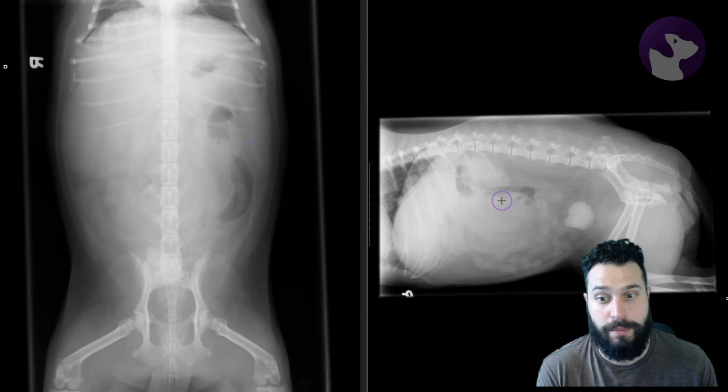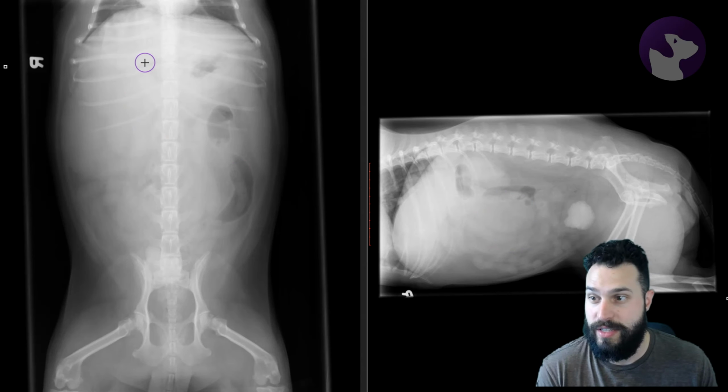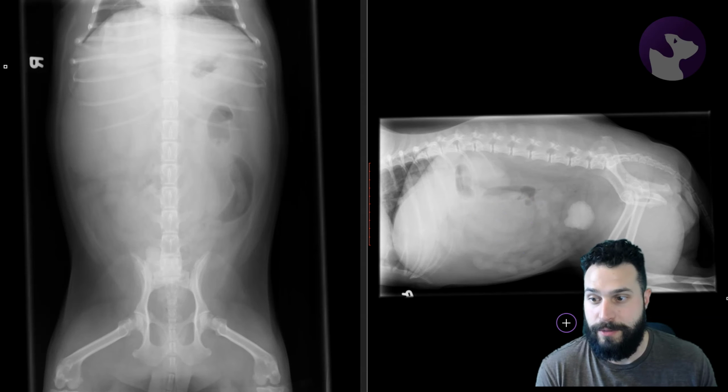the spleen that's sitting up a little bit dorsally, causing displacement. Another being a hepatic mass, which is actually what it is in this instance. This is a hepatic mass extending caudally here. Or there could be lymphadenopathy in the cranial abdomen, something like a jejunal or mesenteric lymph node that's become enlarged and causes this mass effect to be present.